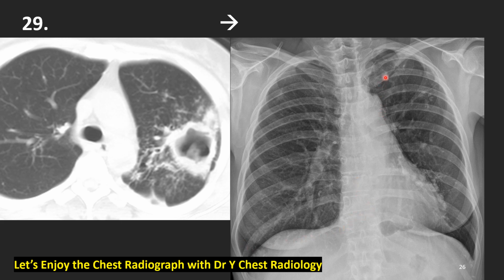There are many calcifications, well-defined nodules of calcification everywhere on the left side. And the left side lung is looking darker than the right side, with smaller pulmonary vessels on the left side. This suggests volume loss in the left side. This is stable tuberculosis after treatment of these findings several years before.